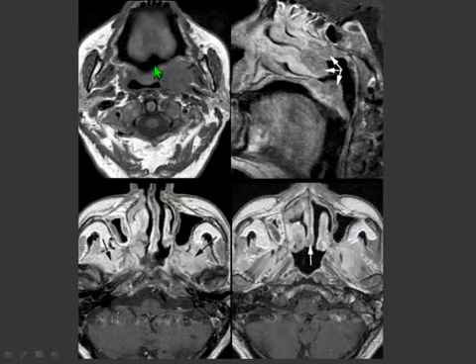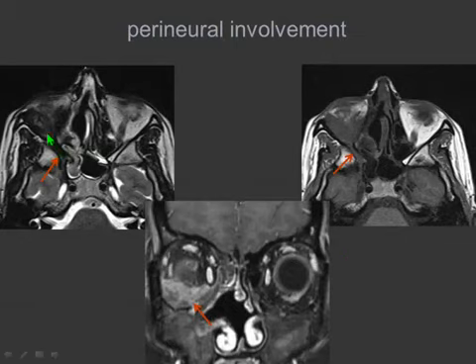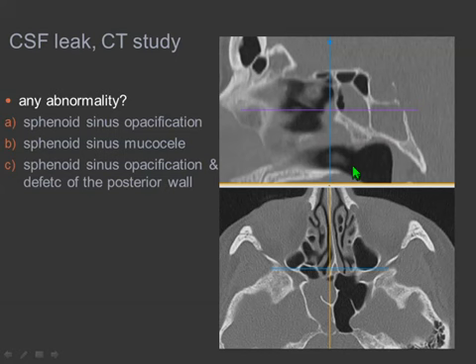You see another example with involvement of the tonsillar area in this patient, and the nasopharynx and the masticatory space, but also, again, perineural involvement with a low intensity. It is very important to know this, low intensity on T2, and also the orbital involvement that is present, accounting again for symptomatology. The final case is this one, a very short one.